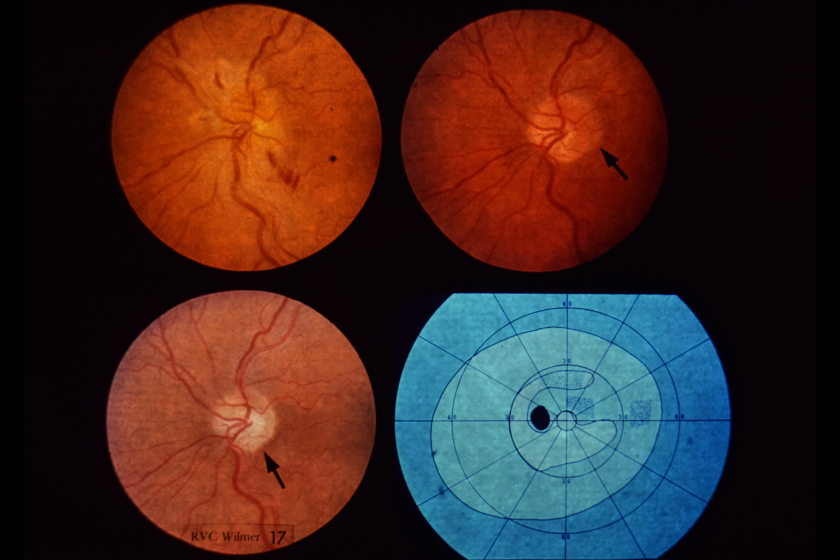The patient had no systemic complaints, and her physical examination was normal, except for a blood pressure of 150/90. No treatment was recommended. Upper right. 3 months later, much of the optic disc edema has resolved, but the temporal disc margin is still indistinct and superficial capillaries are dilated. Lower left. 2 years after initial visual loss, there is pallor of the inferior temporal optic disc with loss of the peripapillary retinal nerve fiber layer. This area of pallor corresponds to a superior arcuate visual field defect seen lower right.